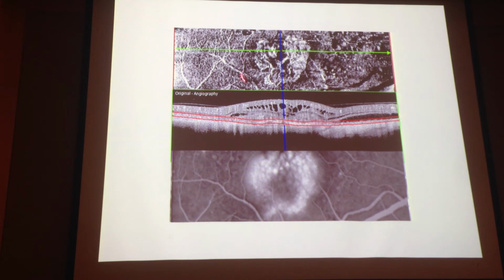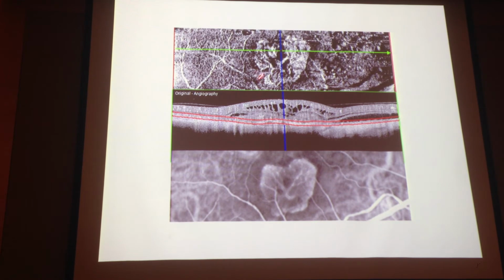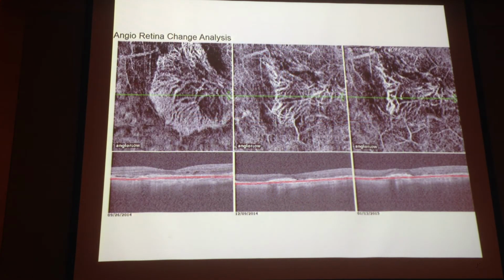Now, of course, when we compare an angiography, of course not with a fluorescein, but with an ICG, the appearance of the lesion is quite the same. Unfortunately, we don't know which is the artery and which is the vein. Probably nobody right now is using the feeder vessel treatment as a principal approach to this type of choroidal neovascularization. But sometimes it could be interesting to know. And again, this is a patient where we treat with a double treatment.